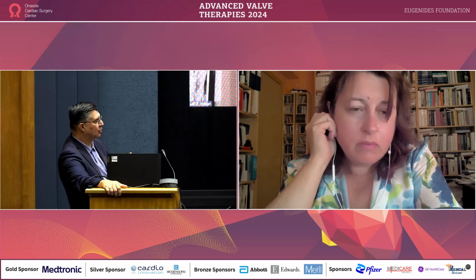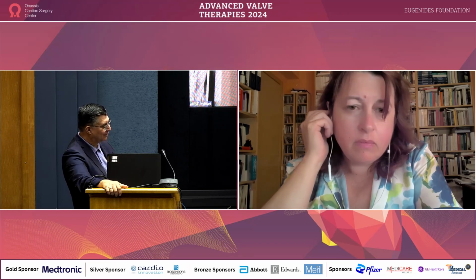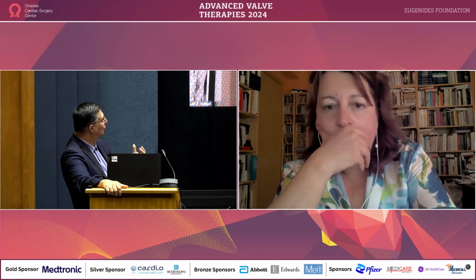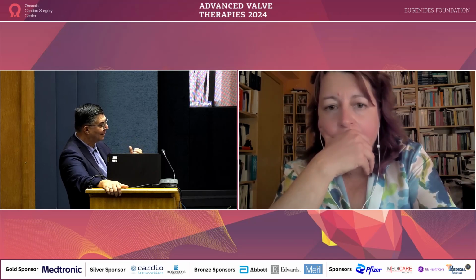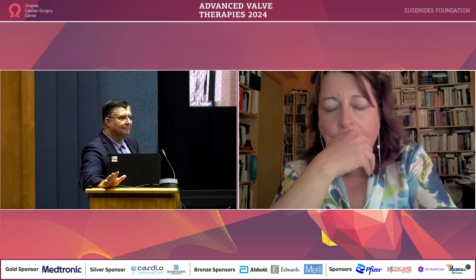You have to make them correspond. You know what you're looking for, and it's something that you must be doing quite frequently. So there needs to be some experience. You mean to go in appropriate double oblique images in the aorta, that much sagittal, that much coronal, that much? Yes. Well, that's what I'm asking, the corresponding. Yes, so maybe we would discuss with the echocardiographers, because this is different.